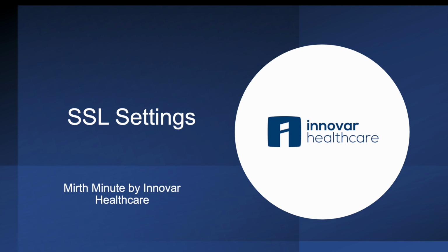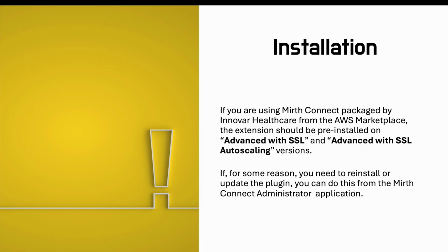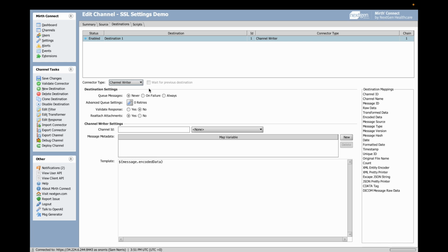Today we'll be reviewing the SSL plugin settings in Mirth Connect. Mirth does not natively support TLS SSL on the HTTP connector. Encrypting your traffic is essential for transmitting data, especially patient health information. Using the SSL settings plugin allows you to enable SSL, TLS both when receiving and sending messages over HTTP.